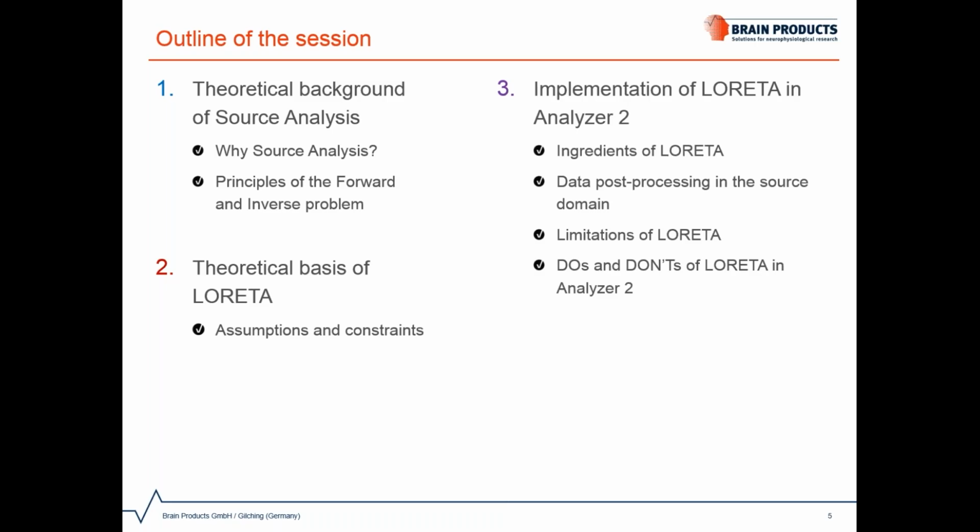In this section, we will also open up Analyzer and demonstrate how to use LORETA and also how to extract certain measures from the output of LORETA using simulated and experimental data.